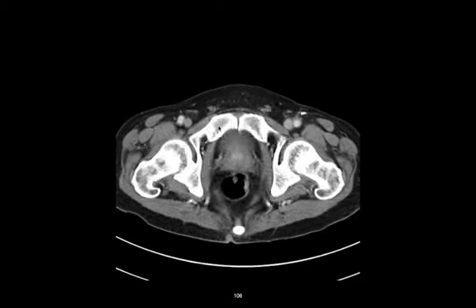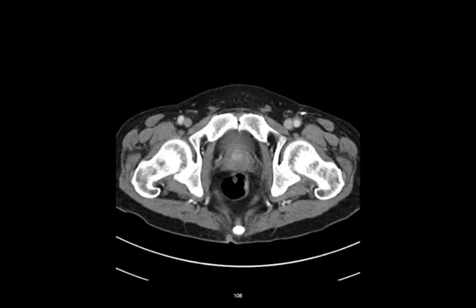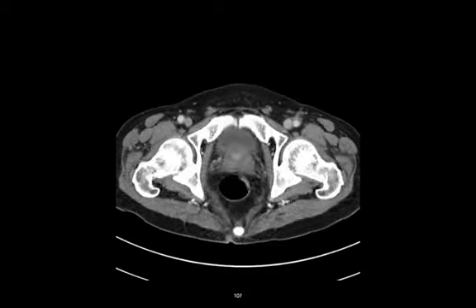And so watch what happens. We see this bone that goes anteriorly here. That's the pubis that makes the pubic symphysis. And then this one over here, this is the ischium and the ischial tuberosity right there. Okay, so now let's go to the abdominal wall muscles.